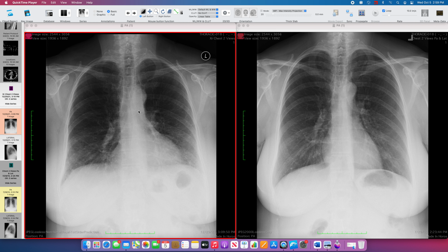But it also can be an indicator that there is actually disease present. Whether that's due to, say, atelectasis from a central obstruction, or in this case, where we've got a lower lung peripheral reticulation in the setting of the decreased lung volumes.